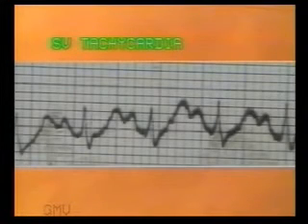In this ECG, the RR interval is 8 millimeters, so the rate is 186 per minute. P waves are present. QRS complex is normal. So this is paroxysmal supraventricular tachycardia. To put it in very simple words, only when the RR interval is less than 10 small squares, call it a paroxysmal supraventricular tachycardia.